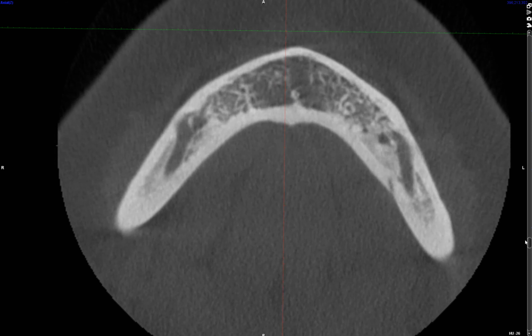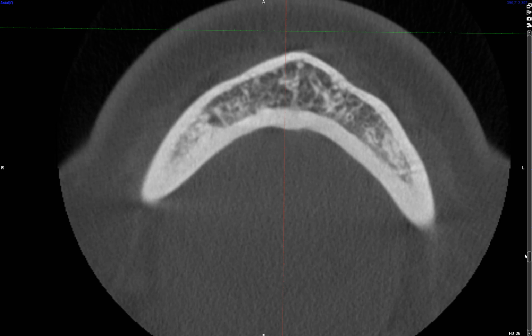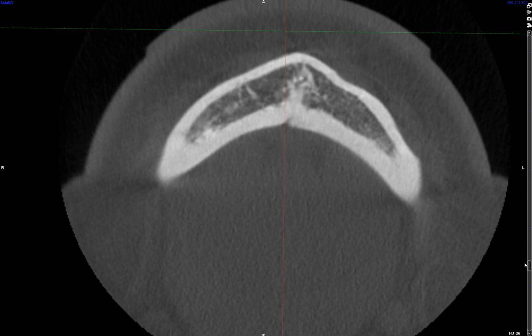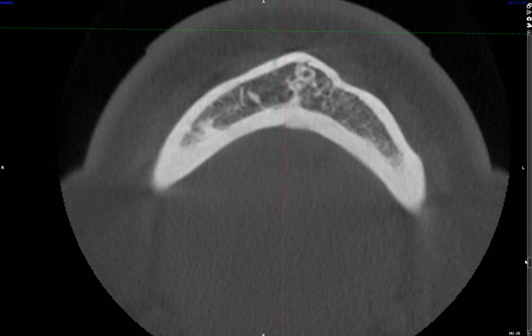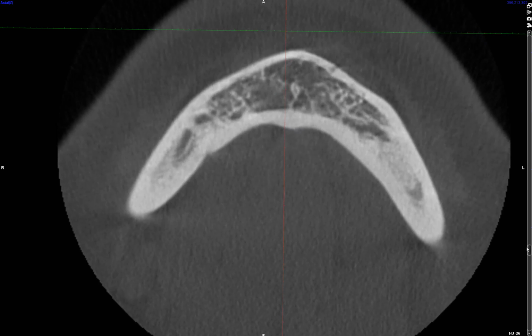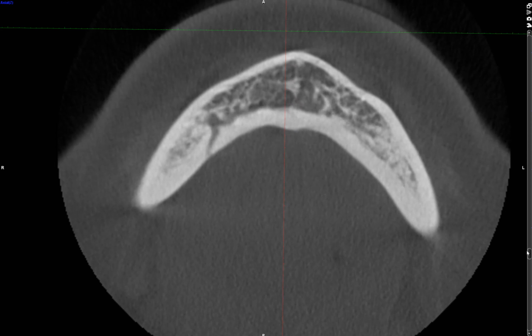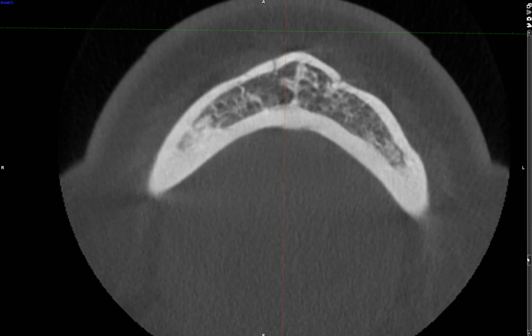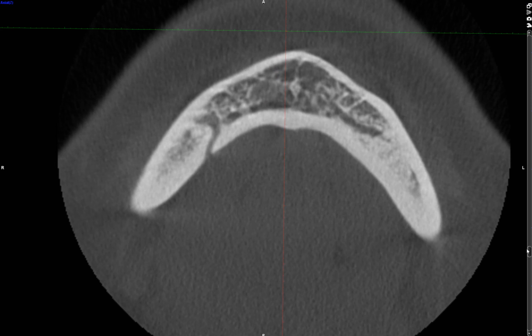So I call this super incisive nerve because, again, I don't ever remember, perhaps there has been a case, but it's highly unusual that I can actually trace it all the way as well as this one, but we can in this case. Whereas if we now look to the patient's right side, you'll quickly realize that it's not very obvious where it's coursing, whereas it's a lot clearer on the patient's left side.